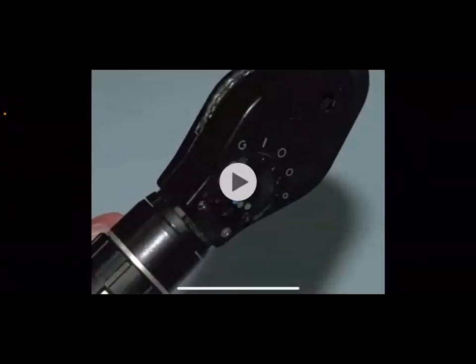Okay, how to open the light source? Ophthalmoscope has got a handle, okay, which is the part of the ophthalmoscope you grab with your hand. Okay, at the top of this handle there is a rotating cuff. Okay, this rotating cuff, you will use it to open the light source, and you will use it to adjust the intensity of the light, as you can see in this video.